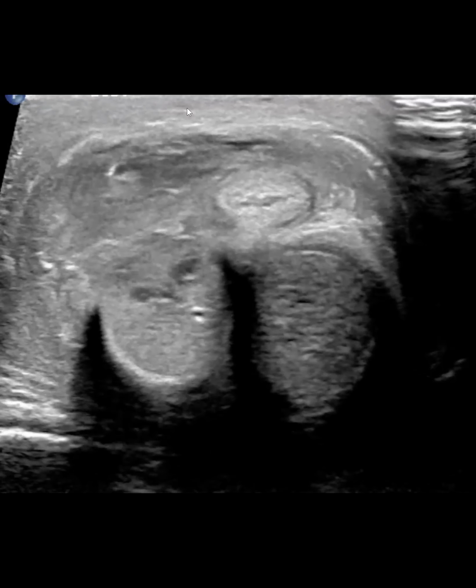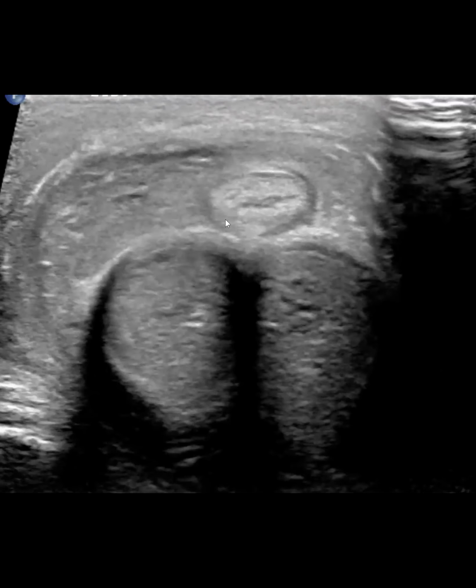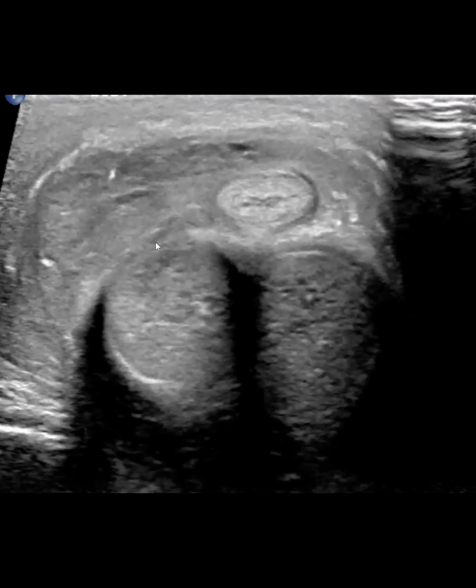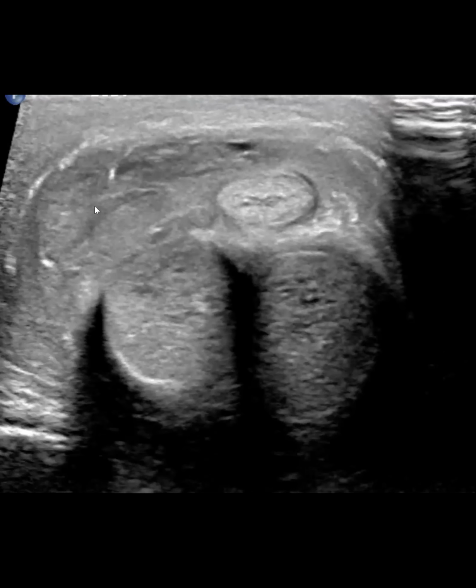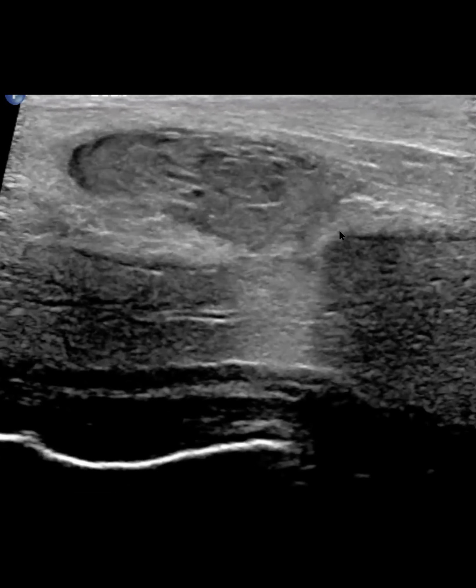is disrupted in this region. You see it continuous around this corpus cavernosum, but here it is disrupted. And there is a hypoechoic area here, which is avascular, reaching up to the corpus spongiosum. So this was rupture of the tunica albuginea, and the patient presented with a penile fracture with a hematoma on the right side. So I'm just going to show you the sagittal view now.